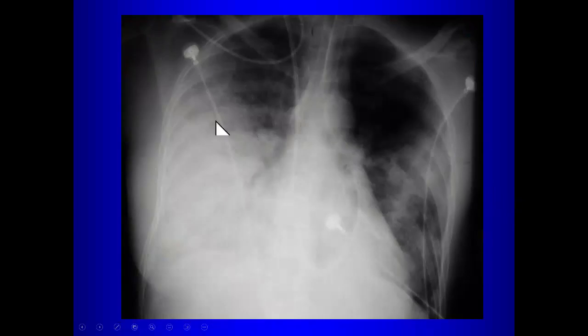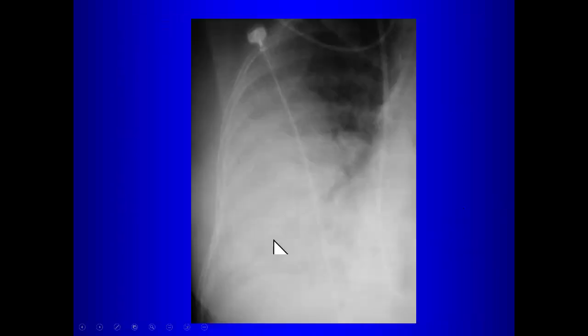This patient has a consolidation here, and when we look closely, we can see the airways are outlined nicely inside of the consolidation. So this is a particular sign in radiology. Do you know what this sign is called? Yeah, so this is an air bronchogram sign.